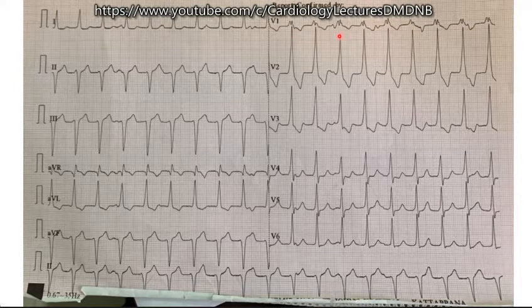So in a patient with junctional tachycardia, how will you explain the sinus rhythm or sinus P wave? Sir, if they are retrogradely conducted and reset, if one side is blocked and another side is retrogradely conducted, then it can happen, sir. No, what should happen? Retrograde conduction of the P wave. Junctional tachycardia with a retrograde block.